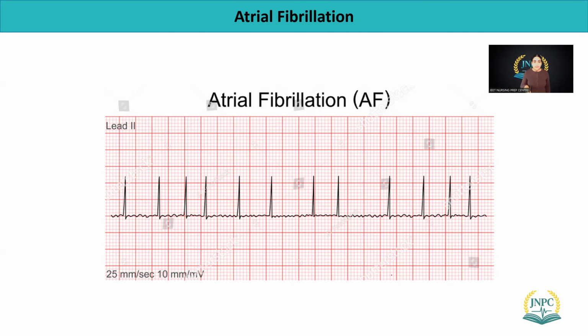first of all, do your math again, ask your questions. Is it regular? First question, check the gap. Sometimes wide, narrow, wide, narrow, so the R-to-R interval is not regular. That is the first thing: this is irregular. And second thing, can you look at PQRST? Not really.